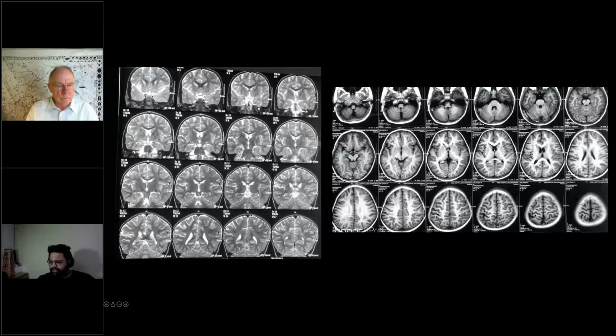Yeah, the T1s, you can see the cortex, it's not malformed, it's actually gliotic. Yeah, post-acquired injury would be the hypothesis as Dr. Mankara said. Okay, some old injury, and that's it. Yeah, we don't have the diffusion, but I don't think the presentation is acute, so we wouldn't expect any changes on diffusion. There were no diffusion changes. Okay.